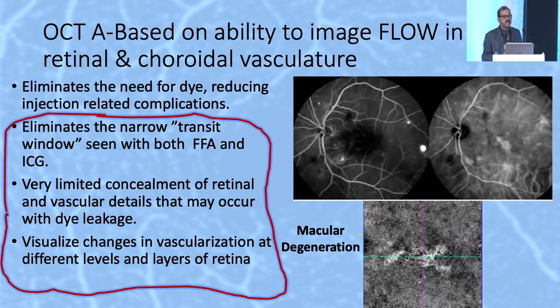Another major advantage with OCT angiography is that you can visualize the changes in vascularization at different levels in the retina. At what level the vascularization is normal, at what level the lesion is present, you can very beautifully delineate with OCT angiography.